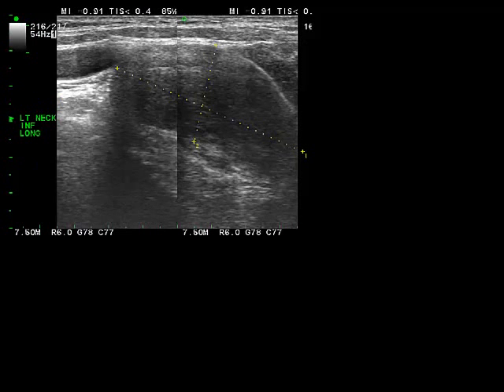So this is a patient who indeed has neurofibromatosis, and those areas of homogeneous soft tissue in the chest and in the pelvis with low activity represent the normal neurofibromas. What we see up in the neck is one of the neurofibromas that's undergone malignant degeneration and is now a malignant peripheral nerve sheath tumor, which is a variant of sarcoma.